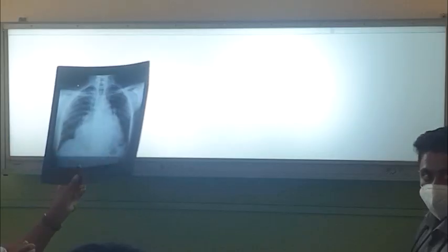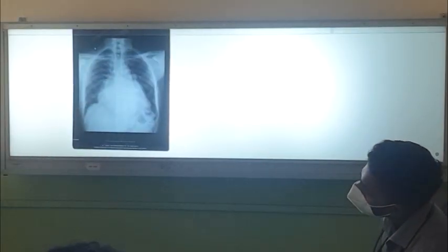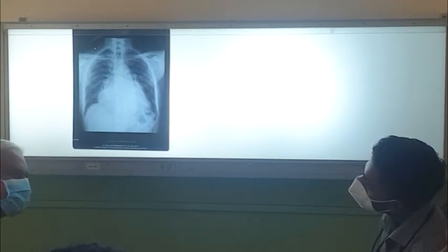And then this patient came to me this Monday. But you saw this, you saw this. What is this? Can you see this?